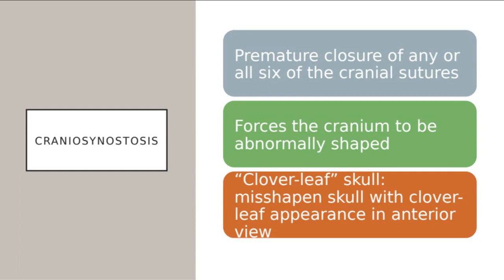One of the more common shapes with craniosynostosis is the cloverleaf skull. It has a scalloped or buckling type of appearance to it. And although craniosynostosis can be its own isolated finding, we're usually going to see cloverleaf skulls with other chromosomal or genetic abnormalities. So if we happen to see an abnormally shaped skull, we don't want to just leave it at that. We want to say, okay, what else is going on with this baby so that we can have the best and most accurate diagnosis.